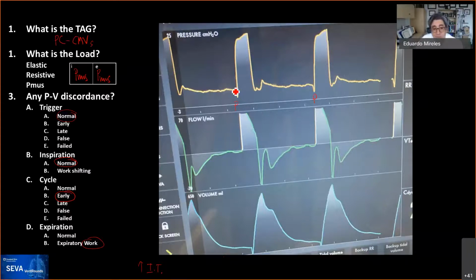That is not pathognomonic of a patient-triggered breath. What tells us that it was the patient, or that the machine thought it was the patient, is a change in color on the waveform, and each ventilator has a different one. Some of them have it pink, orange, white, whatever. So here you go.